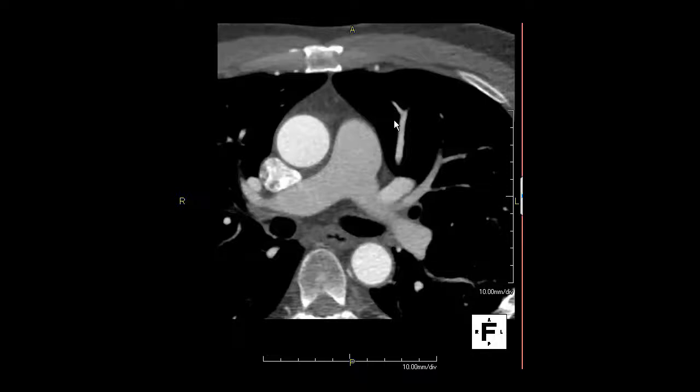This is case L3 CCTA 102. The case history is a 52-year-old gentleman who has now had new onset chest pain. We begin with inspection of the study.